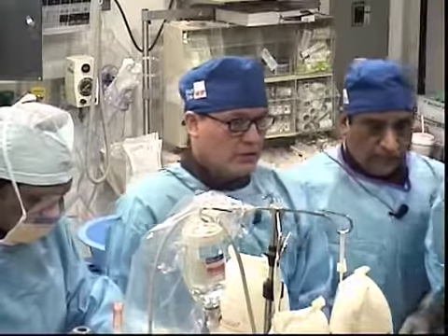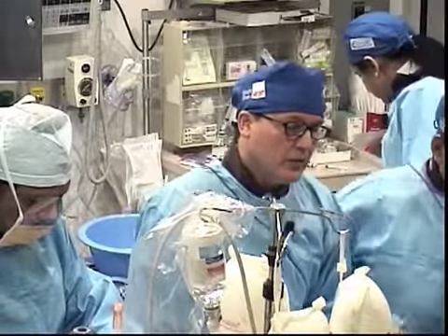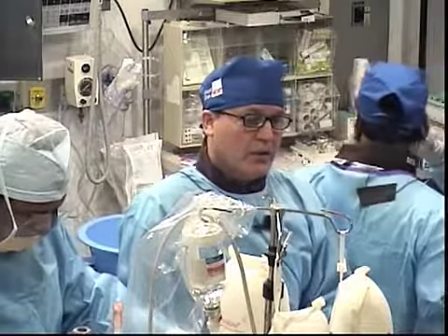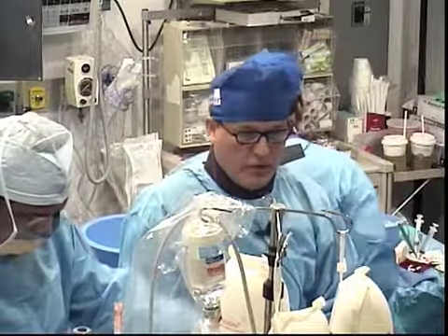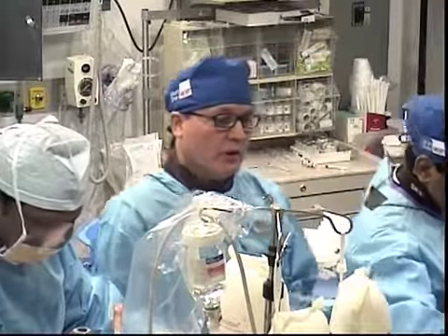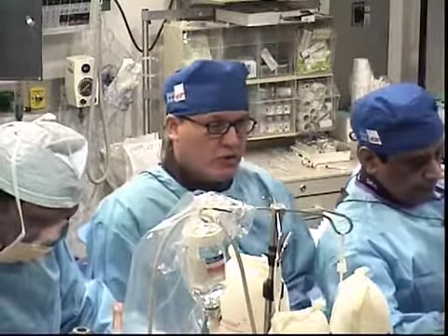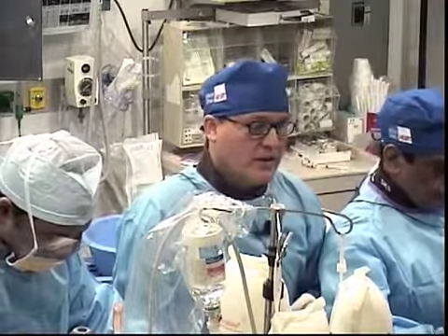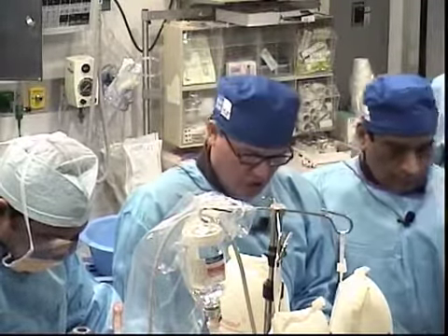Yeah, thank you, Dr. Sharma. Well, OCT is really the best technology you can have in the cath lab because of the tremendous resolution. Resolution is everything for imaging because you can quantify the structures of the vessel wall as well as the struts and the neointima that is covering the strut.